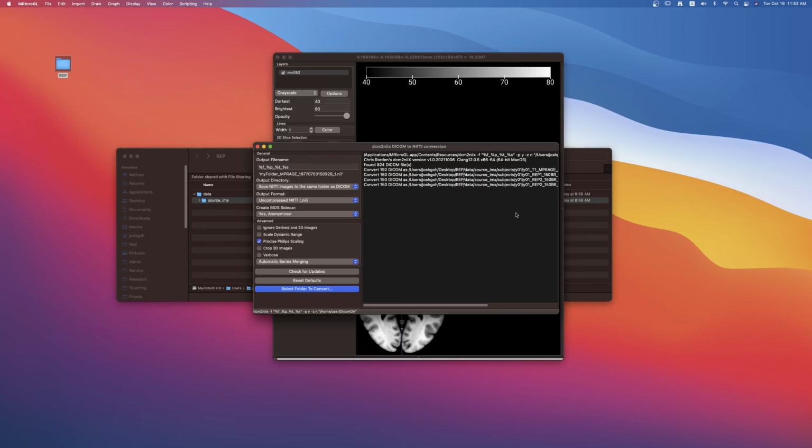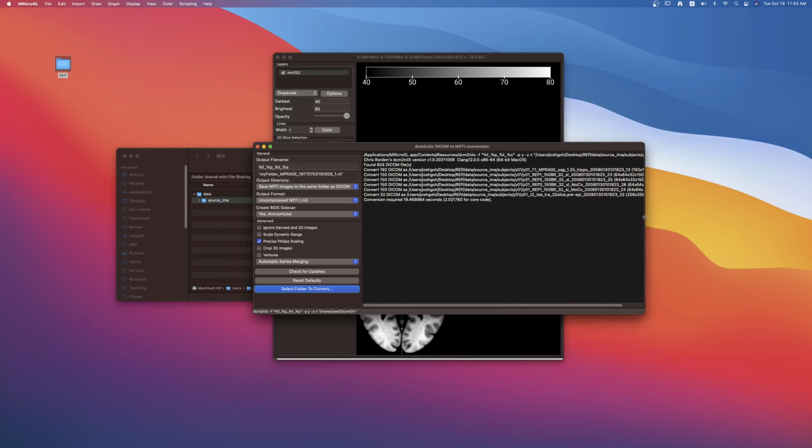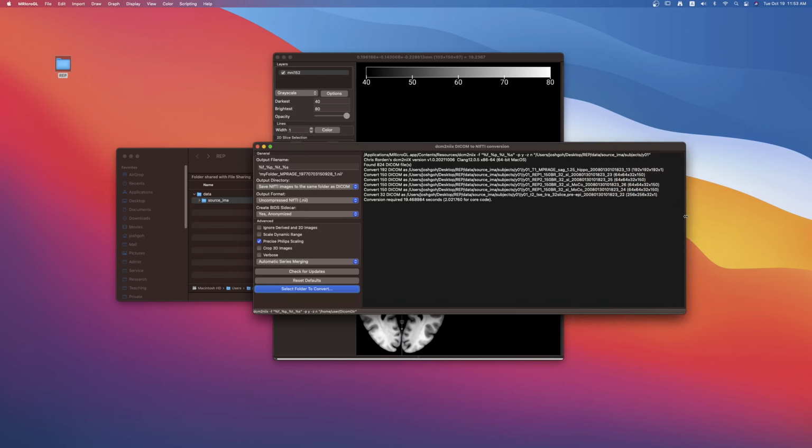As it does that, it will report the files that it has generated one step at a time. Here, let me open the screen, and you can see that it will have generated the T1, the Rep1 and Rep2 EPI images that were original, plus the Rep1 and Rep2 EPI images with the MoCo here. That's the automatic Siemens motion correction script that it runs. Remember, we ignore these two. We don't want those. And also, of course, the T2. This is the T2 image here.